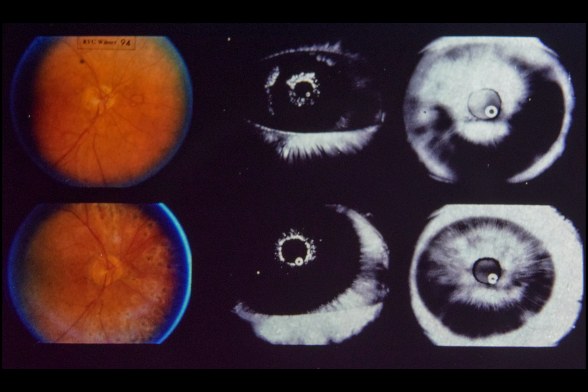scatter argon laser photocoagulation. Iris angiography before photocoagulation is shown above and 2 weeks after photocoagulation below. Upper center, 22 seconds after dye injection, note marked peripupillary rubeosis and new vessels along temporal perimeter of iris. Upper right, 4 minutes after injection, note marked dye leakage into iris stroma.